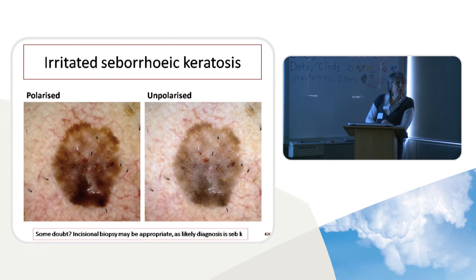But another reason for polarized and unpolarized is that the seborrheic keratosis shows up different structures on polarized versus unpolarized. And this greyish colour is across the whole lesion. We're not seeing those orthogonal white lines. But sometimes SKs have to come off too. What do you think about that sort of lesion being anaesthetised and then curetted? It all comes off very easily with curettage.